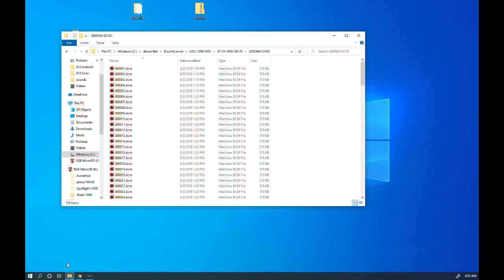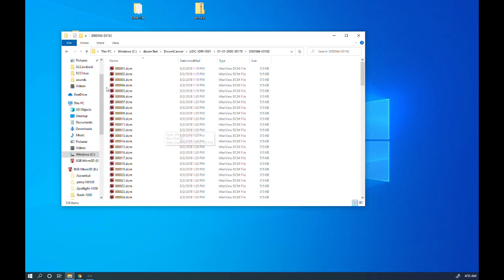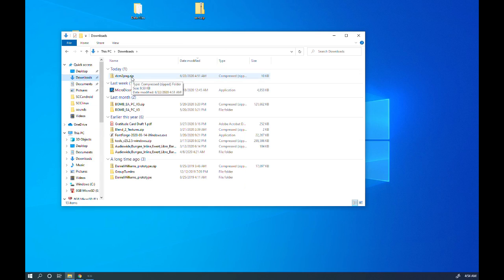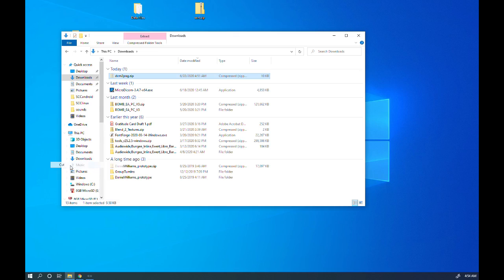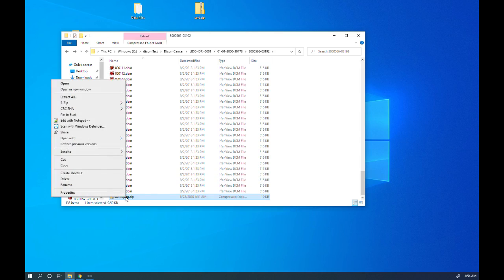So what my Python script is going to do is put these in order. Many times Dicoms don't come in order spatially, and hopefully this will reorder them, so that I don't have to do this manually. From what I read online, this isn't always guaranteed to work, but it's always worked for me so far. So give it a try. If it works, great. If not, then you'll be sorting them by hand.